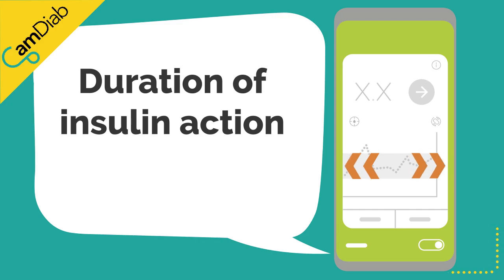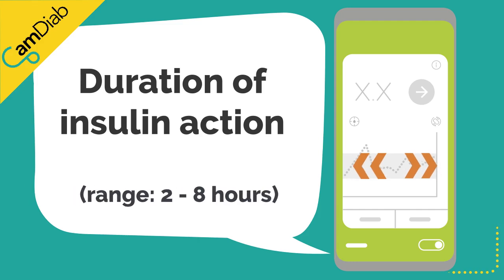6. Duration of insulin action. This duration of insulin action or active insulin time is only used to calculate the insulin dose when a manual correction is requested by the user. This value does not influence how the algorithm calculates its own insulin delivery.